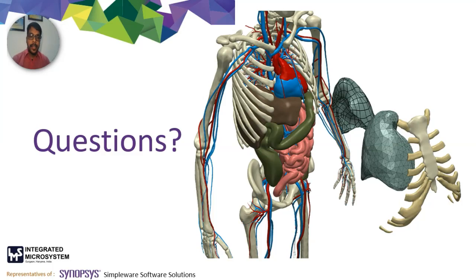And another addition, a very important addition to our software, is the automated solutions. Those modules are machine learning algorithms. They are machine learning modules which do the complete segmentation automatically. Right now, the available packages are for knee segmentation from PD-weighted MRI scans and cardiovascular segmentation.